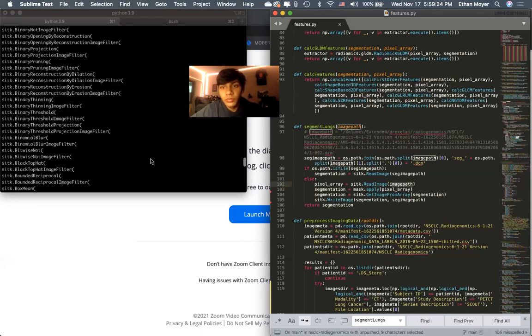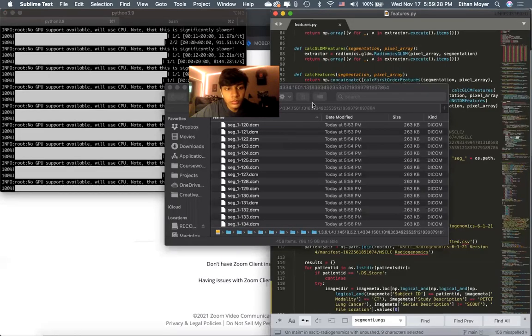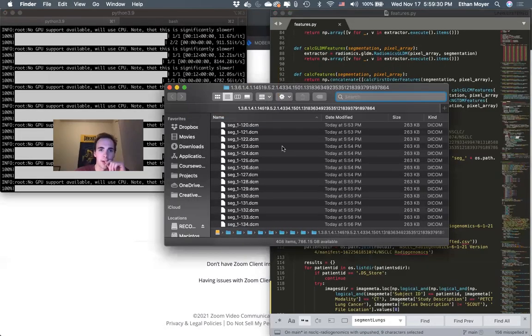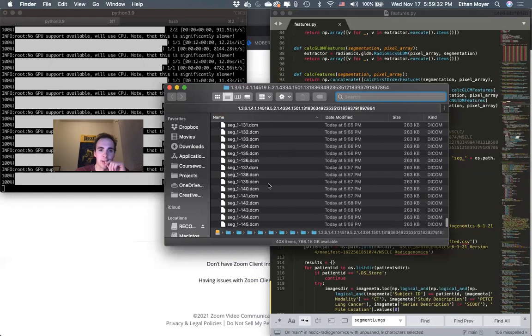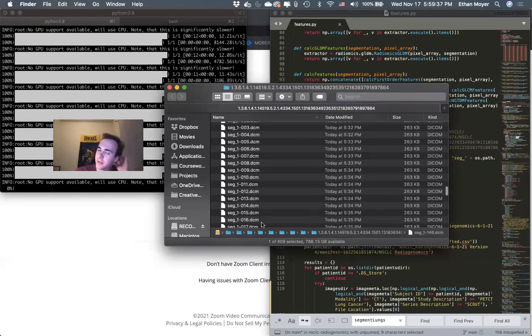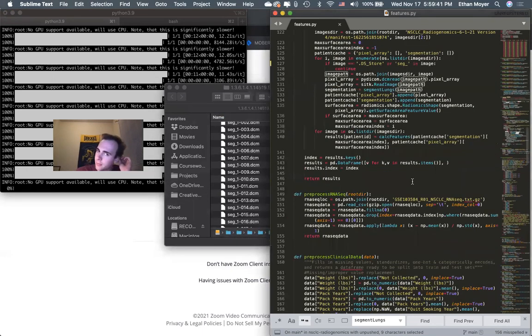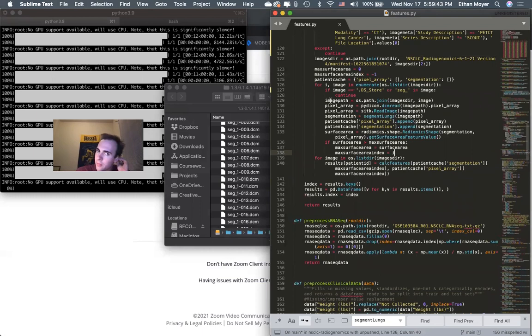I'm testing it again to see whether it shows up. I have my external hard drive connected right now, and I'm generating segmentations for all these files, testing it on one patient file. But the featurization works because I have a for loop going through each image and finding the maximum area, which ends up being halfway through the image anyway. So that makes sense.